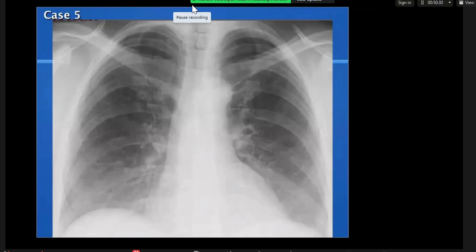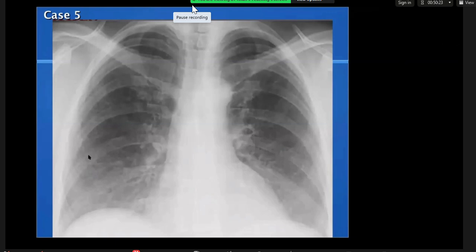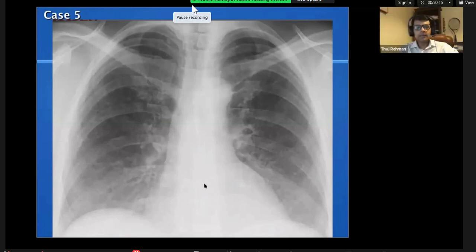Is it cystic reticular shadows or is it more nodules? Yeah, I think it's more nodules now. I think it becomes fuzzy in there. So I've got tiny nodules scattered throughout both lungs, predominantly involving the mid and lower zones. And excellent. So immediately after picking up the abnormality, you went into distribution.